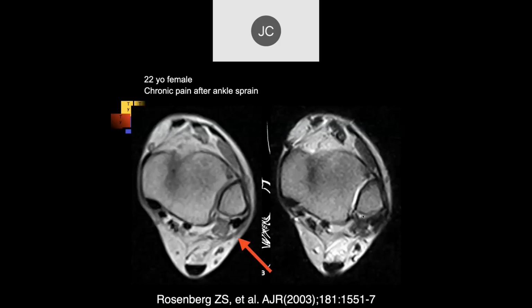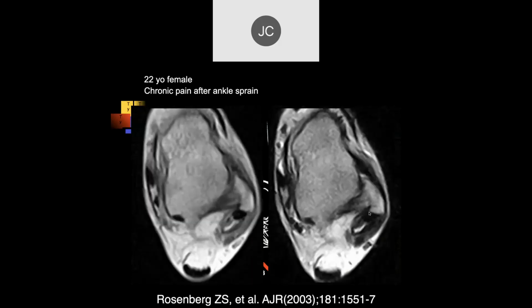Here are the tendons. Now, this also is something we'll talk about. We're kind of proximal here, where the posterior aspect of the distal fibula is rounded. As we go more distally, it tends to flatten, and at the level of where the tendons abut the posterior aspect of the lateral malleolus, it really should become concave. If we go more inferiorly here, we can see thickening and increased signal intensity within the lateral retinaculum.